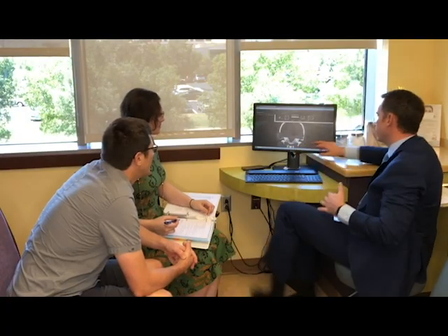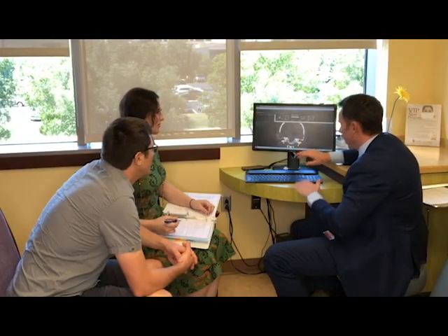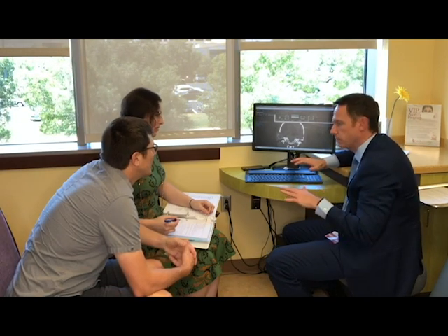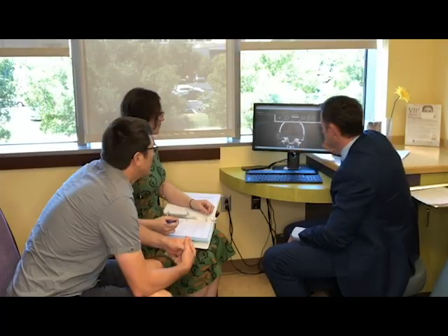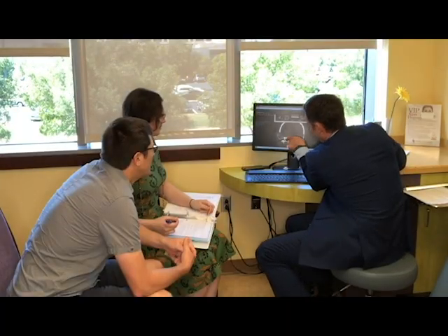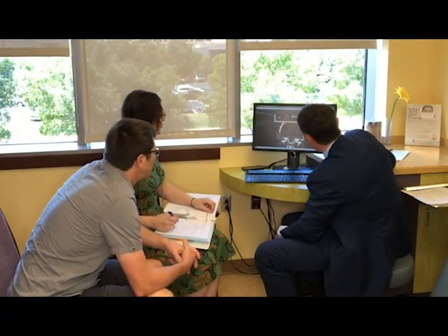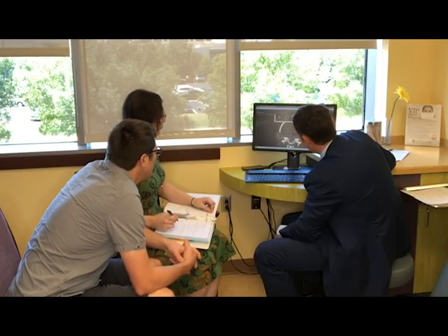Now, if I look at this in the operating room, and we do this a lot, everyone's roof of the middle ear is very, very thin in almost everybody. So it's thin at baseline. So I'm guessing there is some involvement. I can't rule out that this hemangioma, or let's call it hemangioma just for discussion right now, is involved here.